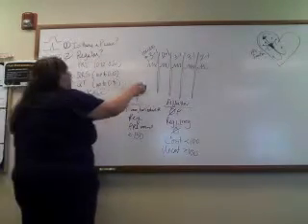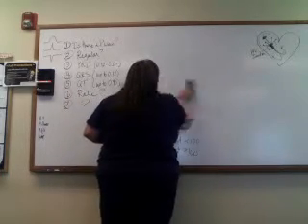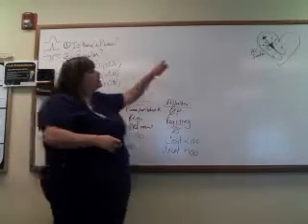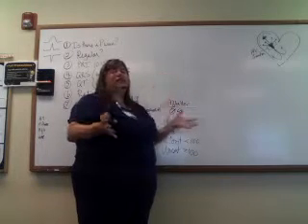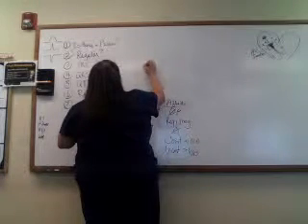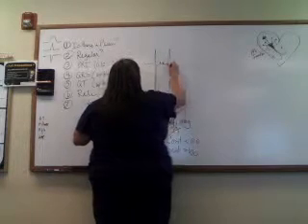So with this one, we had one point that was malfunctioning. If we have multiple points that are malfunctioning, then our shapes are going to look different. Because remember, the time that it takes for that point to get down to the conduction pathway, all that does is make a shape. And so those shapes are going to look different. So with this one, we're going to have erratic looking shapes.